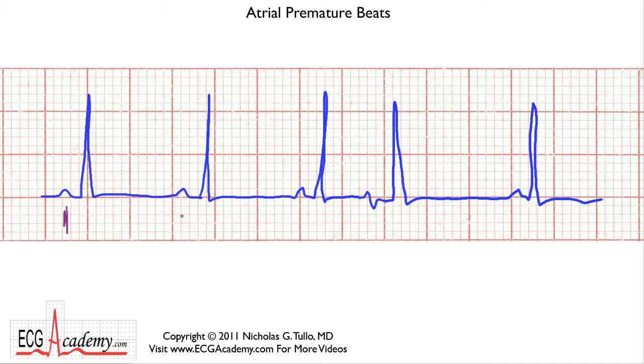The sinus rhythm, unless you have some degree of sinus arrhythmia, is going to be relatively regular. The PR intervals should be fairly constant. And the way I've drawn this beat is that the P wave clearly looks abnormal, because it's coming from some ectopic focus. It's premature because it lands sooner than you'd expect if you were just going to map out the sinus nodal beats.